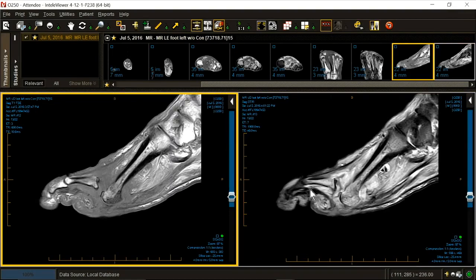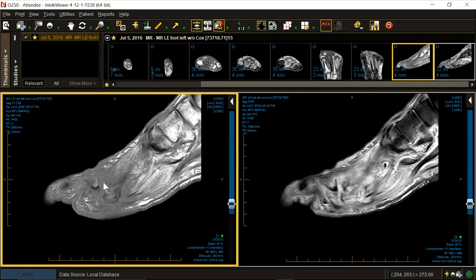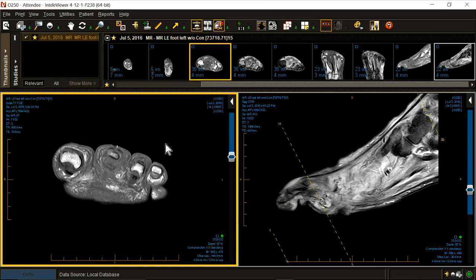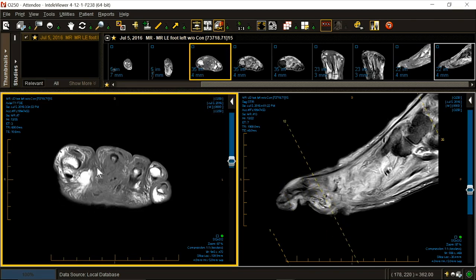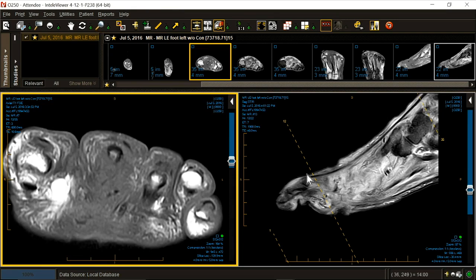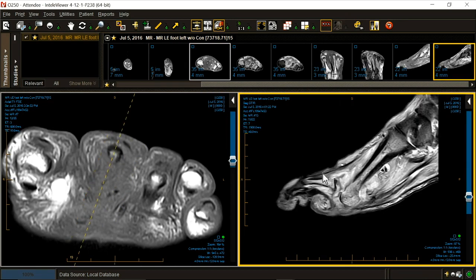This time we have signal on both sides of the articulation. We have loss of bone substance along the plantar aspect of the metatarsal, right there. Look at the bone erasure at the base of the proximal phalanx. Let's look at it in the short axis view. There's some bone loss right there. That's real. So big penetrating ulcer, osteomyelitis, septic arthritis.